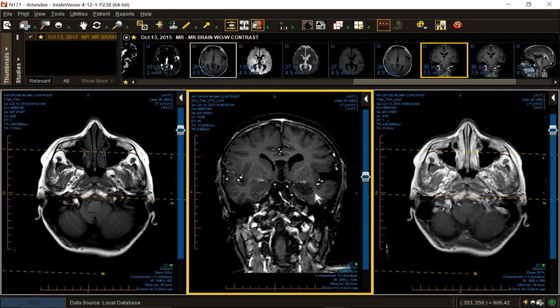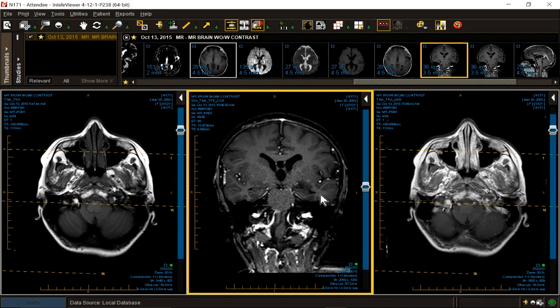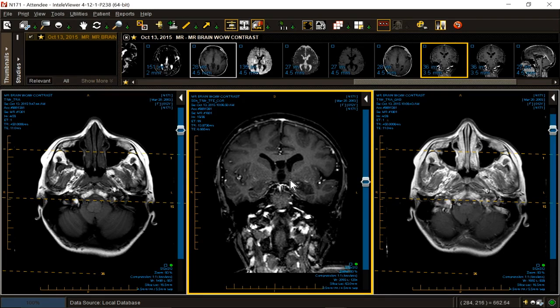Now, one of the classic temporal lobe neoplasms is a ganglioglioma. They usually don't occur this young. They're often calcified, about 35% of the time. They may bleed, and they tend not to have this slightly bubbly appearance. And I would say that this lesion points to the center. It almost points to the third ventricle, like, look here. That bubbly appearance, that paucity of enhancement, the presence of multiple other dysplastic abnormalities, the absence of calcium, the absence of blood favors the diagnosis of DNET.